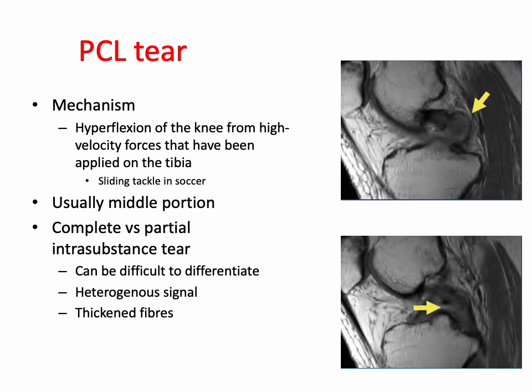On MRI, the PCL usually remains contiguous, although there might be partial disruption. We can have an enlarged or swollen PCL, with greater than 7 millimeters in diameter of the vertical portion on sagittal imaging indicative of a tear. Analogous to ACL injuries, PCL injuries can have posterior tibial translation.